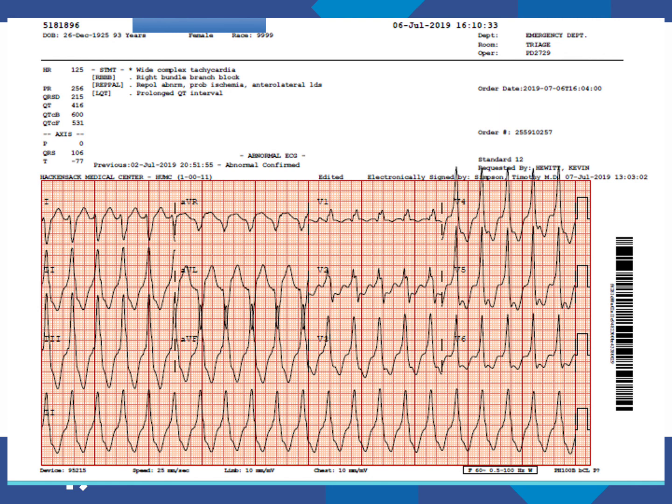So now let's take a moment and look again at this tracing and see what we can conclude about our lady sitting up and smiling in triage. Well, there is positive concordance across the precordium. There is a probable northwest axis. And there is an atypical configuration of rabbit ears in V1 and V2. There also, if you look carefully in V3, is that small little notch, Josephson's sign.